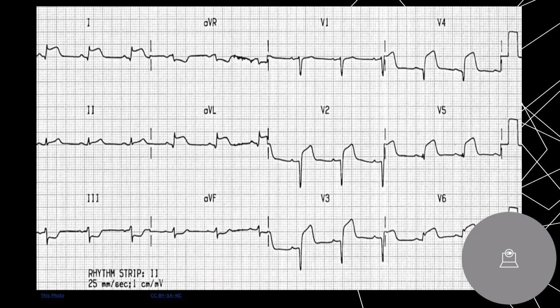Okay, let's look at another one. Highlighter here. Let's go to V1 and V2, septum. Okay, highlight one full complex. The V1 looks all right. It's actually upright this time. How about that? Okay. So let's go to V2. V2, look at this. Elevated or depressed? Right, you go baseline, J point. So elevation in V2.